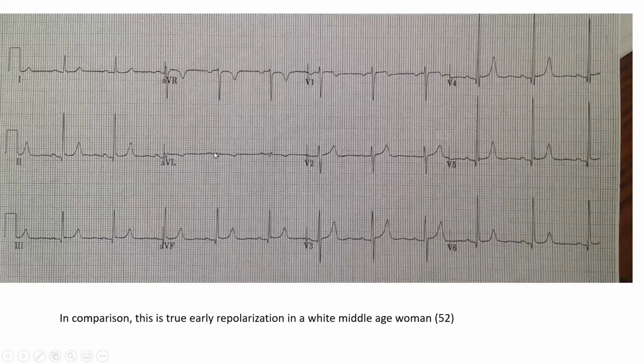This is an early repolarization in a 52-year-old woman, where early repolarization is not common, but you could still say this EKG has classic features of early repolarization. You have a very notched J wave with very concave ST segment and very prominent QRS. STT is much smaller than QRS. That's characteristic of early repolarization. You tend to get pronounced QRS, and STT is much smaller than the height of the QRS. So this was a classic early repolarization in an older woman.